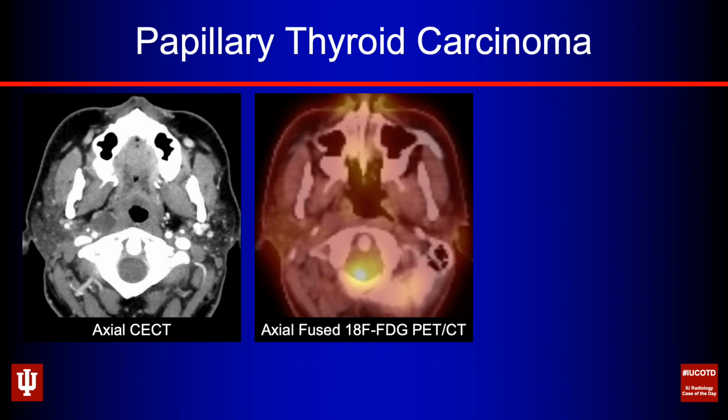Here's another patient that has papillary thyroid carcinoma, and in this case, we have this cystic appearing right retropharyngeal lymph node. Okay, it's sort of oval, certainly enlarged, no doubt about it, sitting between the pharyngeal mucosal space, which is seen more medially, and the carotid space, which is getting displaced posterolaterally by it.